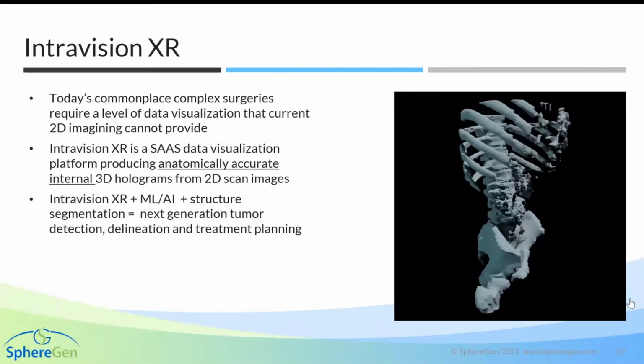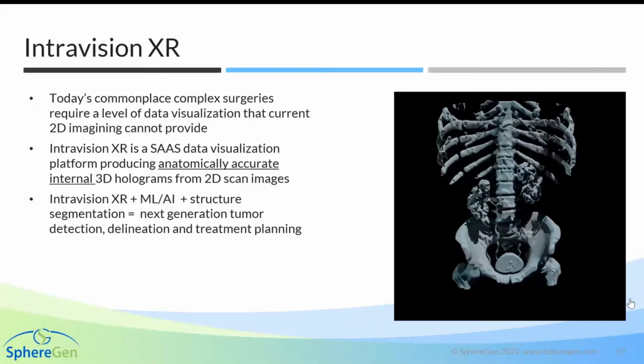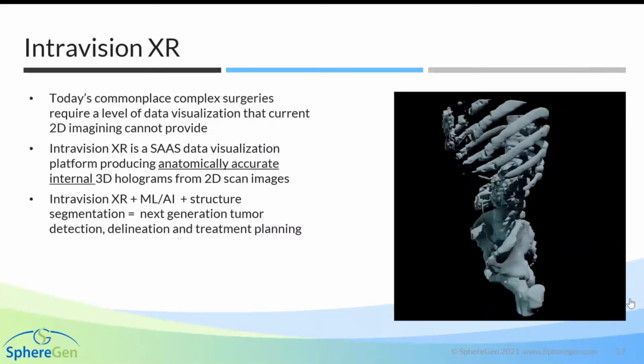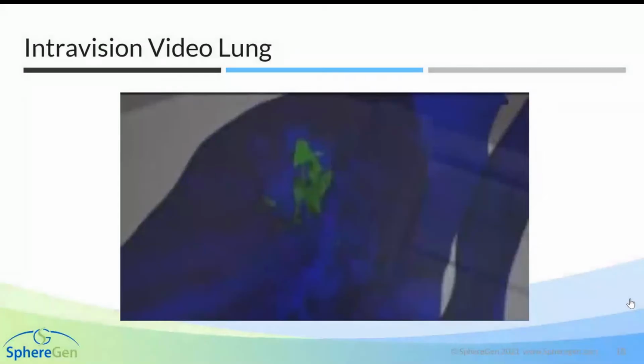If you take a moment, you can see the patient has bladder stones. You can see very clearly that there is actually a gap in the left ureter with retrograde filling from the bladder on the left, a lot of great detail. Let's go ahead to the video.